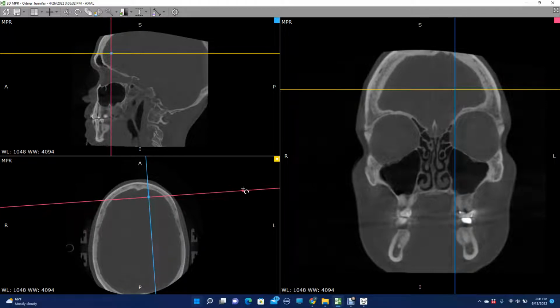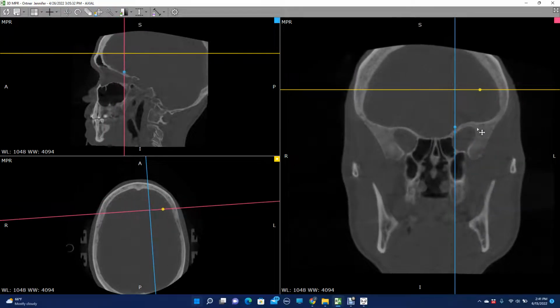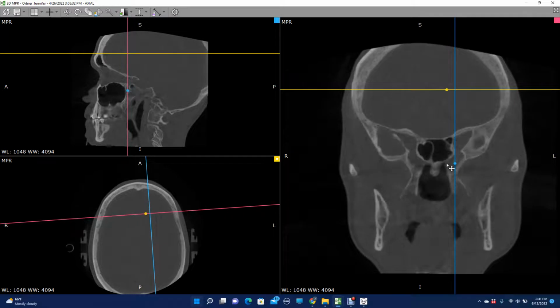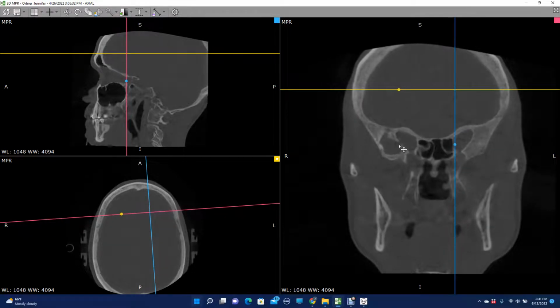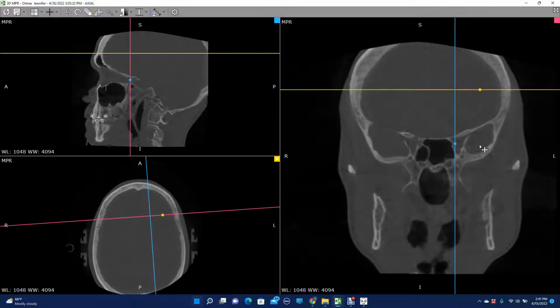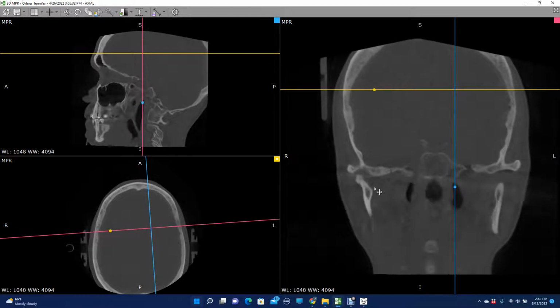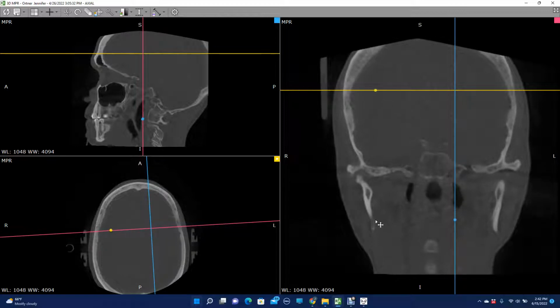And so I play with modifying the rotation of this pink line until, okay, now those eyes close together, closing the orbits. We scroll back, looking at all the features of the face. Are they closing and opening symmetrically? Right here you can see this is asymmetric. This floor, the sphenoid is opening here, and then it opens there. So there's maybe some internal skull rotation, but it looks like my jaws are also not coming into field equally. The right's appearing before the left. So I'm going to tinker with this again, and now I can get my jaws to appear slightly more symmetrical.